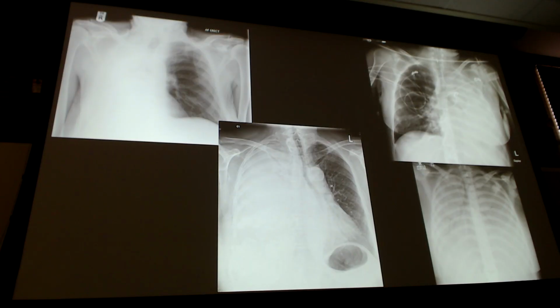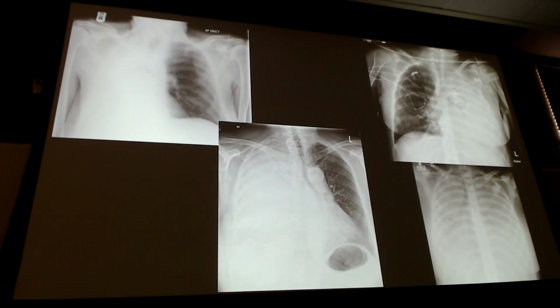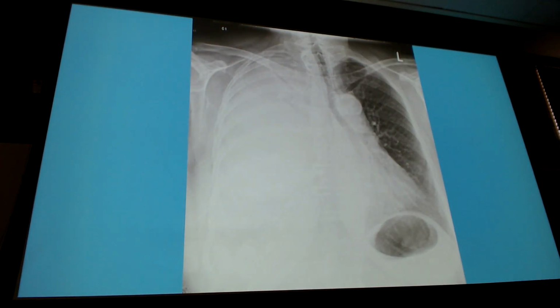Then you have enough here to make a most likely educated guess. But this one here with just the image, okay. Got these now in the blue slides. You notice how this is not a blue slide, right? So when you go to your review, this one will be on a blue slide. It's that same hemithorax one.